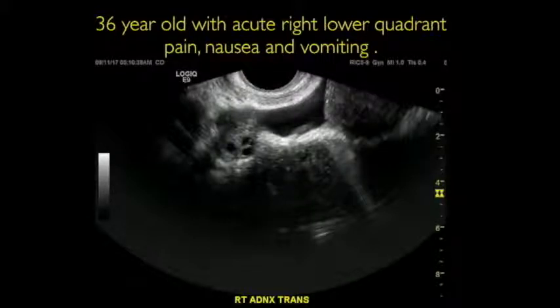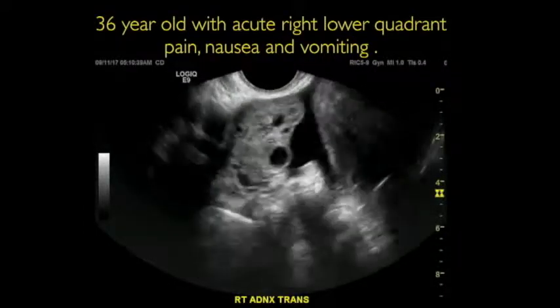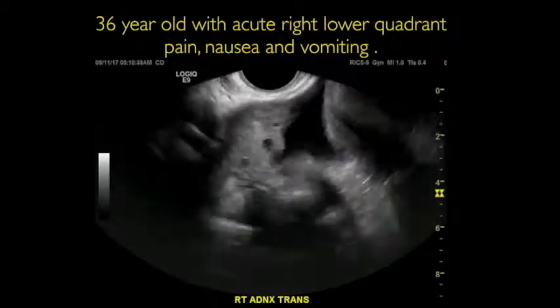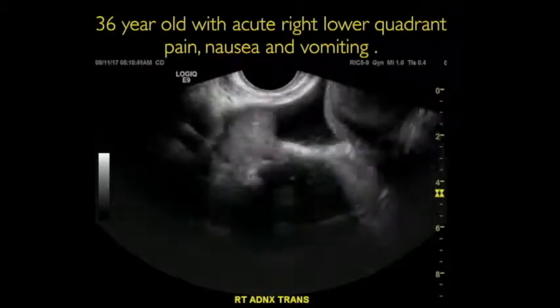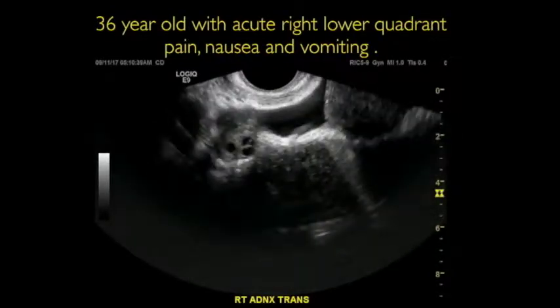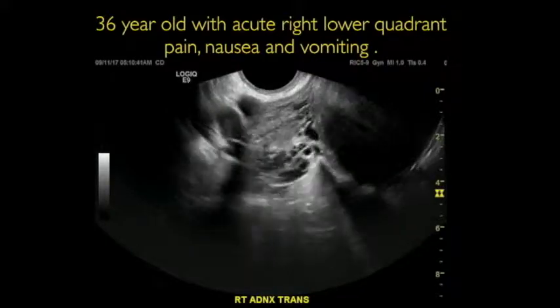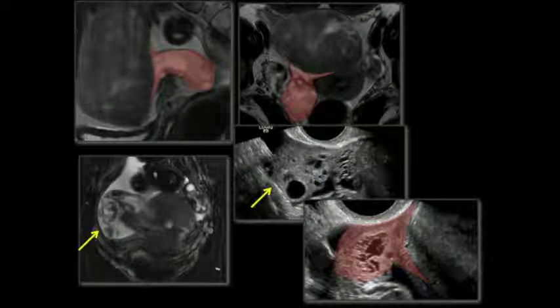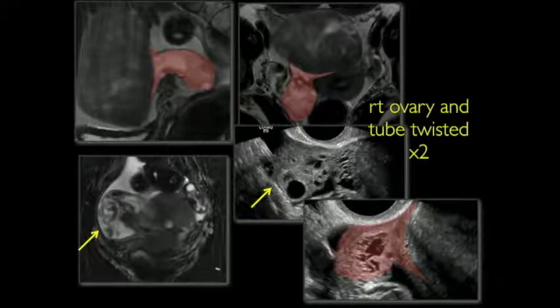Here's another patient, 36-year-old, with acute right lower quadrant pain, and nausea and vomiting. On the cine, it was really hard to find the ovary, free fluid. And you say, well, it kind of looks like a twisted vascular pedicle, and there's a huge mass. Is the mass coming from the uterus or adnexa? In this case, we figured we were dealing with torsion. Could it possibly be a necrotic fibroid? Then we moved on to the MRI, and that beautifully shows you there's a claw sign from the edematous tube and the ovary, and this was a torsed fibroma, which led to this process here.